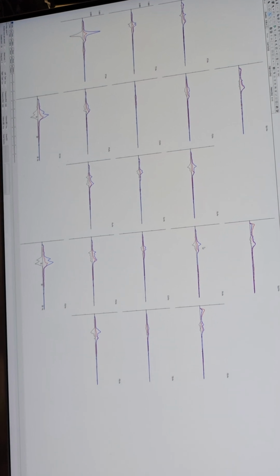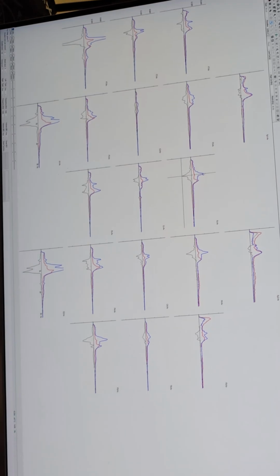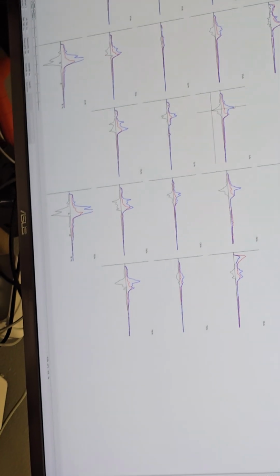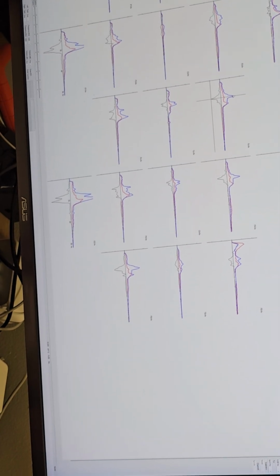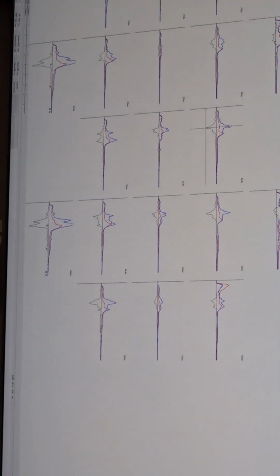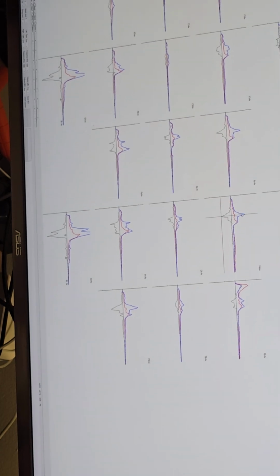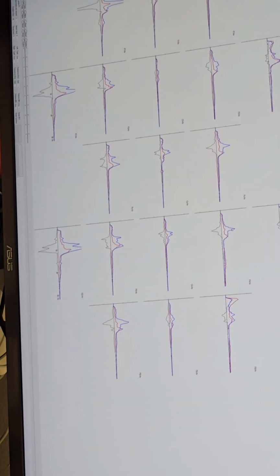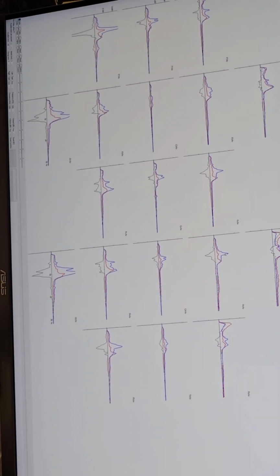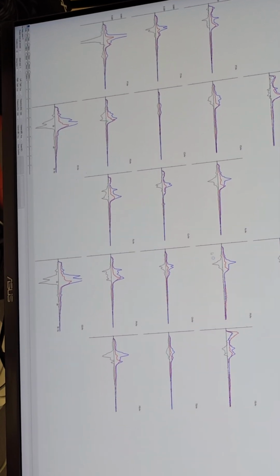There are a couple of things I was really interested in. One is the frontal slowing. We had this 8.3 hertz alpha, and that was pretty slow, you would feel that. And that's at FZ, likely involving the anterior cingulate, but the whole front was pretty slow: F3, FZ, F4. Now, there could be a little bit of drowsiness here. I don't think either drowsiness or adding a lot of caffeine yesterday would account for all of this. They're just not that strong.